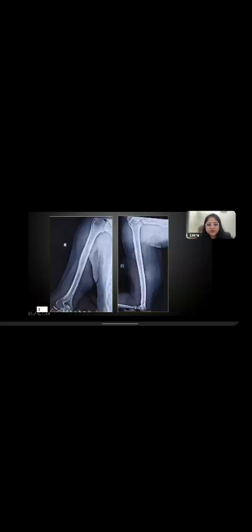Right. So we go to 3. What do you think? Where is the lesion? Is there a lesion? Where is the lesion? Third one. Very good. Malignant transformation, more than 15 millimeter cartilage cap, Shruti, for osteochondroma. That was case 2. So I'll request all of you to just write 3 and then write your answer.